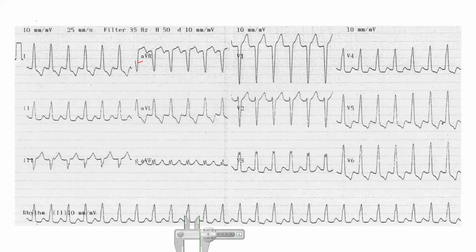Two, an inverted P wave after the QRS complex, or no P wave whatsoever. Those are the three conditions or characteristics of beats that come from the AV node. One of the three: an inverted P wave before the QRS, an inverted P wave after the QRS, or no P wave whatsoever. That is how we arrive at the fact that this is a junctional beat.